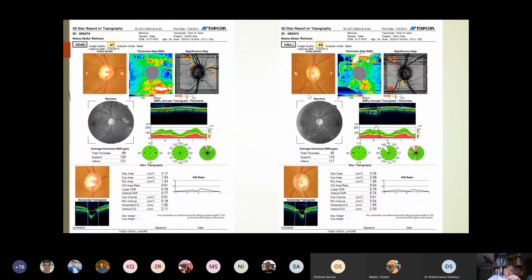The reason I put this chart is I think we forgot to look at these lines. These are very important. These are telling you this is a patient which is showing you red disease because you are picking up artifacts which are actually causing this area to be shown in red, which it actually is not.